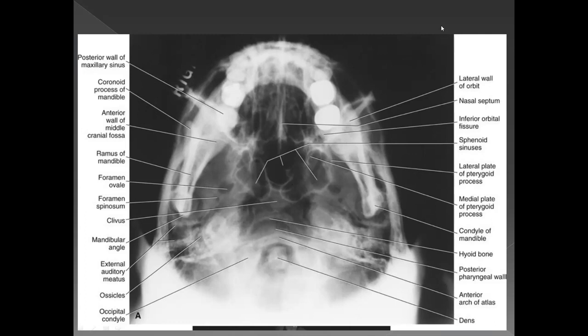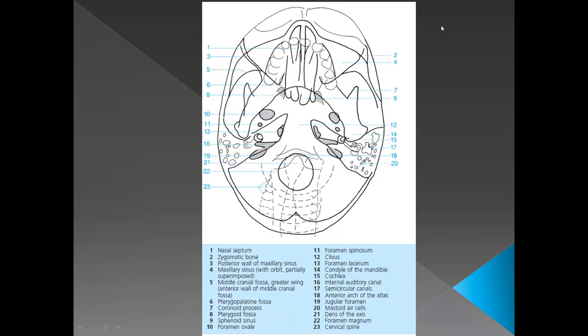Okay. So again, we have an illustrated diagram here of the anatomy, but like I said, since you're doing it basically for the zygomatic arch, I have already shown you that anatomy. So just focus on that, and you really don't need to learn this unless you are academically inclined and you want to do it for your own learning. Then by all means, you can learn the anatomy you see on an overexposed X-ray as well.